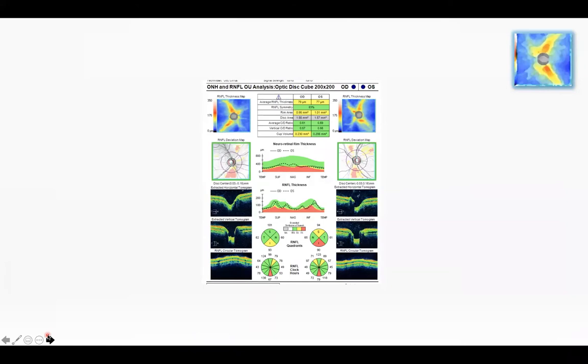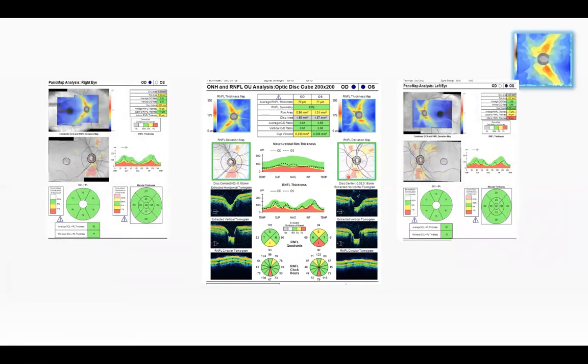This is also an interesting and very common one. I have seen totally normal teenagers started on glaucoma medications because of these variations, as it's more common in myopes and we are having more and more myopia. There are symmetric inferior RNFL defects here. You can see them here and here. When you look at the macular area, there are no defects.